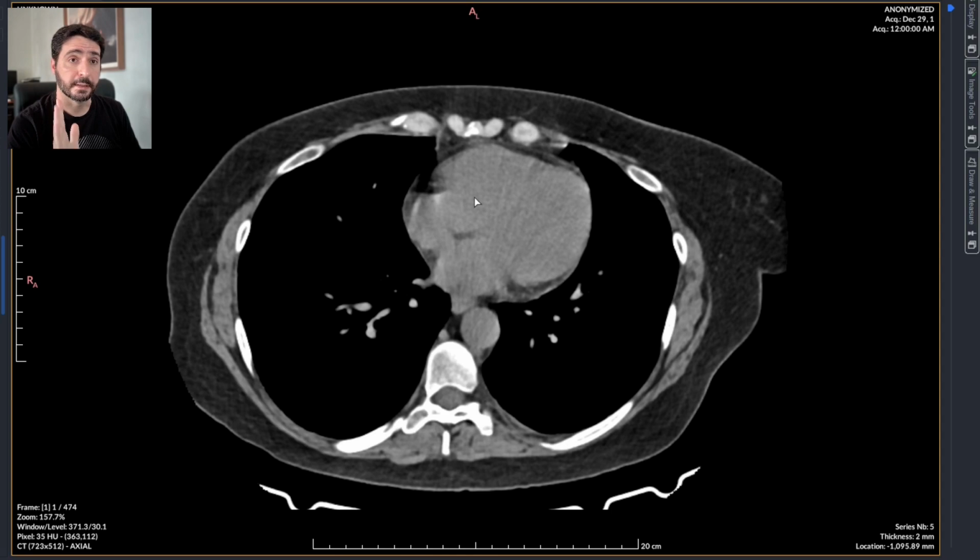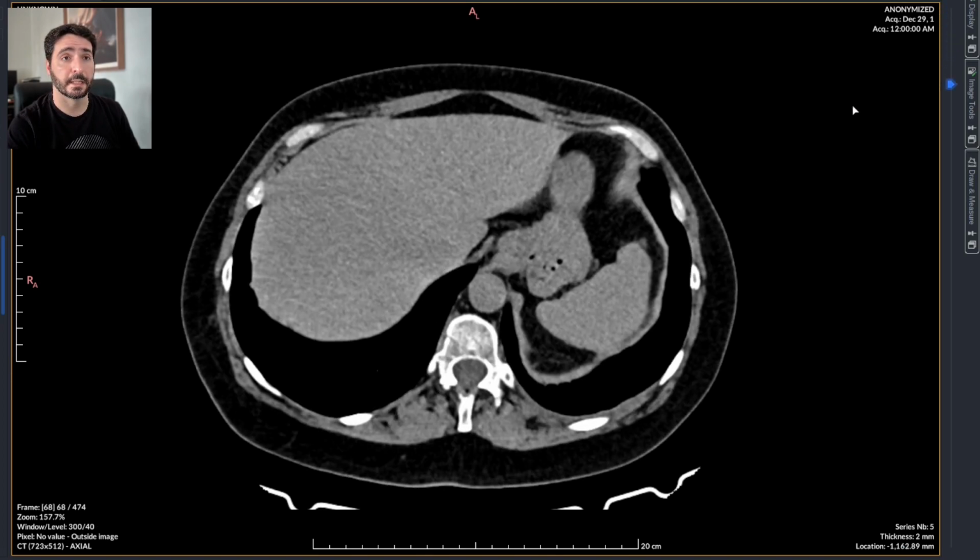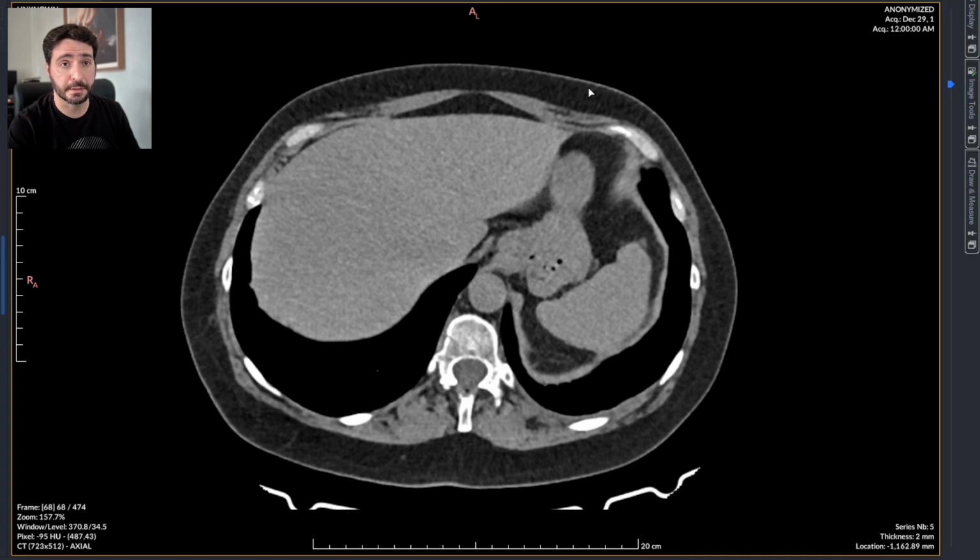So it wasn't just a simple urinary tract infection. It was a very severe and rare complication derived from some kind of acute infection to the bladder and the kidneys. We're going to read this CT scan. We have pre-contrast and post-contrast phases. So let's see. This is the pre-contrast phase. We use this phase to look for stones, kidney stones, obstructions, tumors, cysts, and all that good stuff.